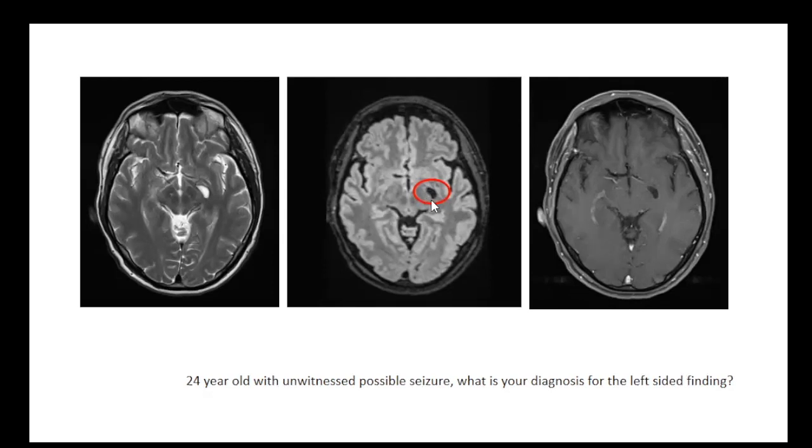Now, in terms of the other possibilities, if we're thinking about an astrocytoma, there really should be something enhancing. And I'm not trying to fool you, this is representative. So we have a non-enhancing CSF space in the medial portion of the temporal lobe. Now, the two things you should think about in this location are giant perivascular space and choroid fissure cyst.